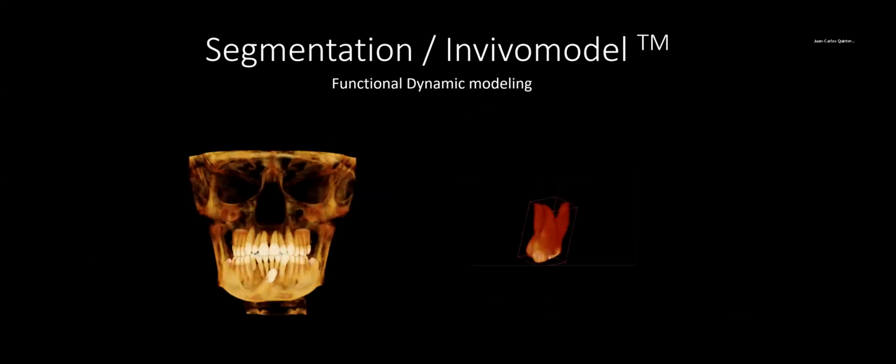So this is the raw data, the volume rendering, the CBCT. This is what you get when you push that button and the Invivo software or whatever software comes with whatever cone beam machine you have will reconstruct all the different files of DICOM into a 3D rendering, okay? So this is it. So when you submit your cone beam raw data to Osteoid, the segmentation process is very proprietary, by the way, and it's very advanced.